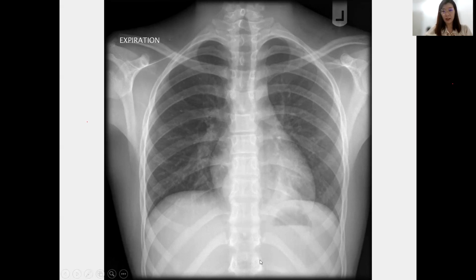Okay, look at the left side, it is nicely delineated, one line, but this one, if we follow it, then we see a bulge here. Okay, if we do not follow the line one by one, we will miss it, correct? Yes. Right, Betty? We will really miss it. Even sometimes when we purposely look, we may also miss it, okay? So must always remember. So this is the paraspinal line opacity, a reminder.